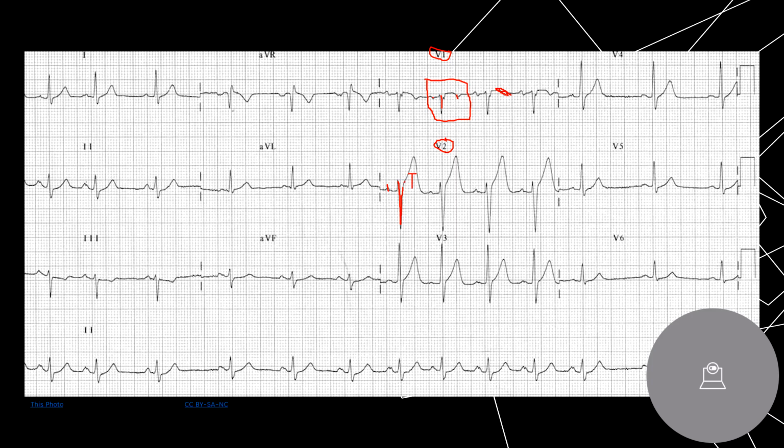Okay? So let's look at this next complex. Remember, go to your T wave first. This is the back side of it. So that's baseline. Now go to the front. Where does the QRS terminate into the T wave? Right here. Right there. So check that out. Is that depression or elevation or what? Exactly. You have ST segment elevation.